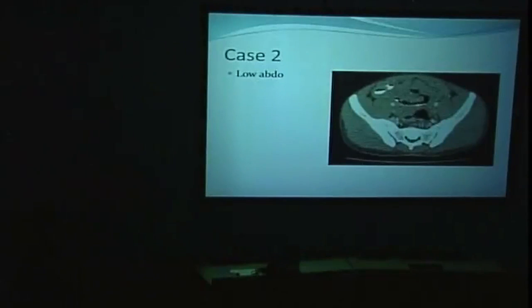And lower down again in the pelvis, we see this loop of abnormal small bowel. Very thick walls, abnormal lumen. And this was the distal ileum, also presumably involved with TB. I think TB was cultured from the peritoneum.